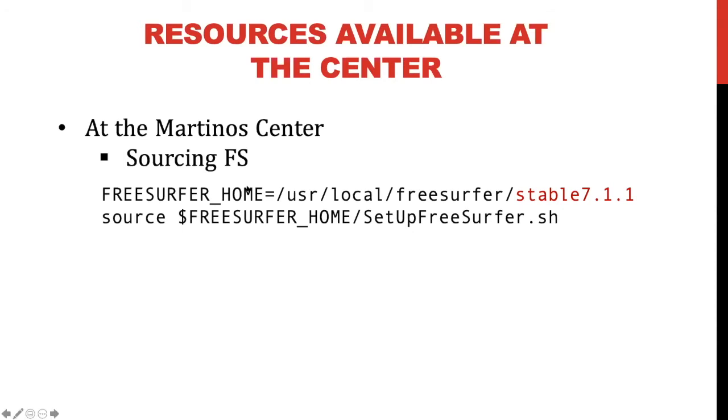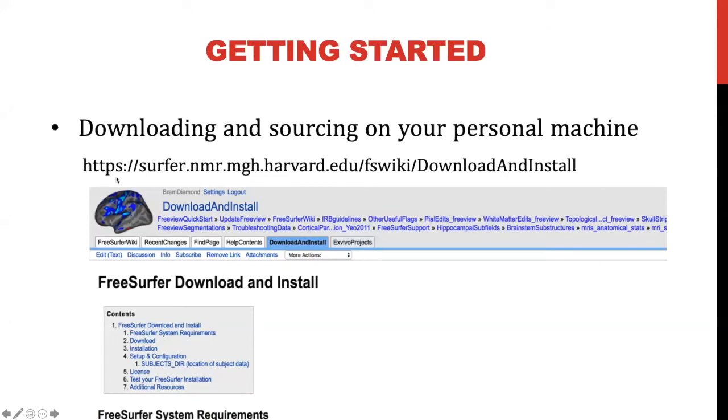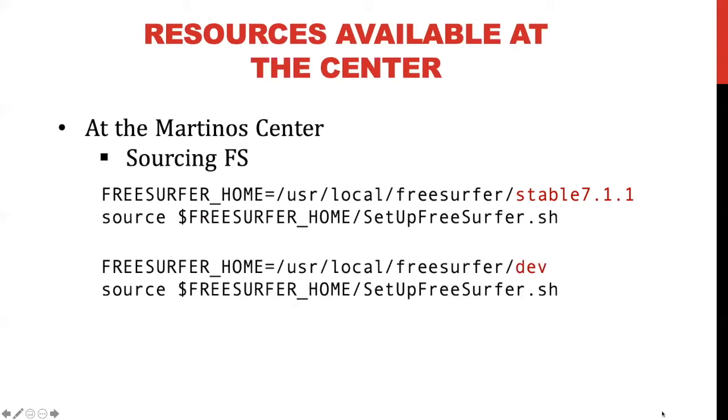And so it's really important to source FreeSurfer using these different commands. This is because in the install instructions, you have to download your FreeSurfer app into somewhere on your computer. And so this is basically you spelling out for your computer where FreeSurfer is located on it.